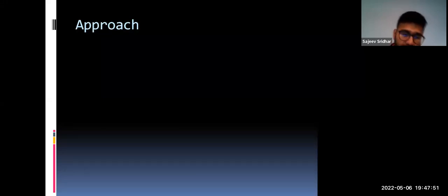Now, like I said before, always start from the top. What do I mean by that? I mean, you have to always start from the very top of the actual CT head itself. You have to visualize the central sulcus, see if everything's okay over there, and then proceed downwards. Because you should not be missing out anything. So that means all the way from the top and then go downwards.